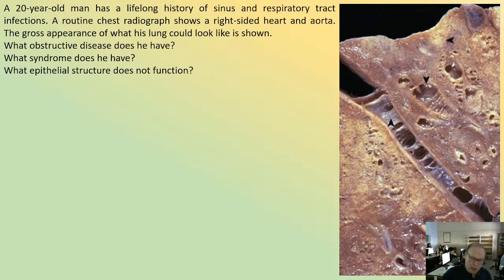And here is another case of pathologically dilated peripheral bronchi. However, what has the inflammatory process caused within the border of two lobes?